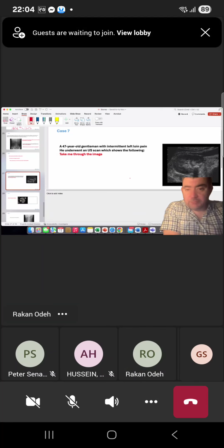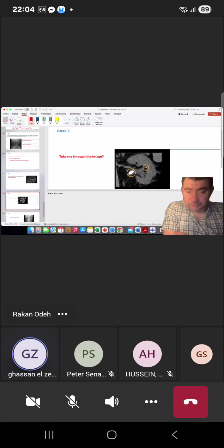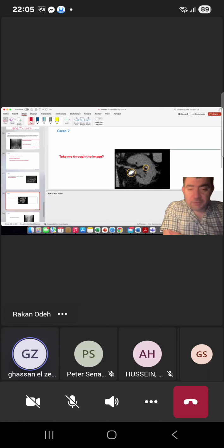I can't really see much other than a destroyed kidney with probably a renal pelvic stone with central acoustic shadow. We need a CT scan for better assessment, CT-KUB. So that's the CT. Don't forget the other kidney and the bladder, okay? Yes, it's in my mind.